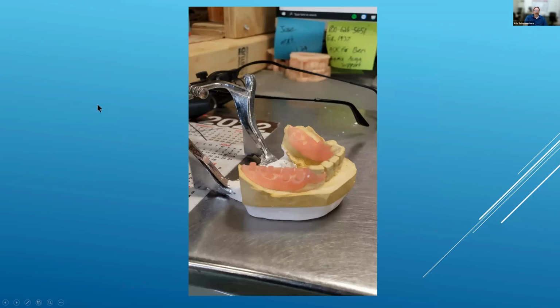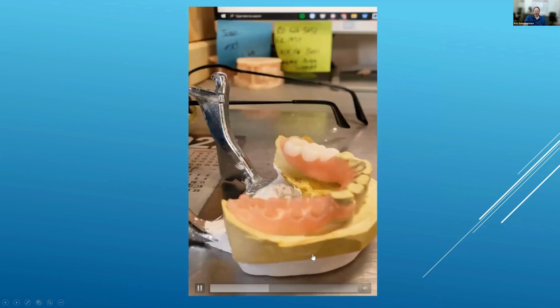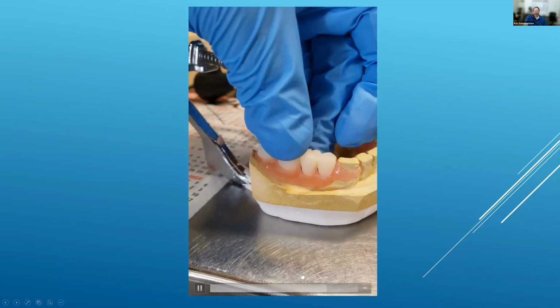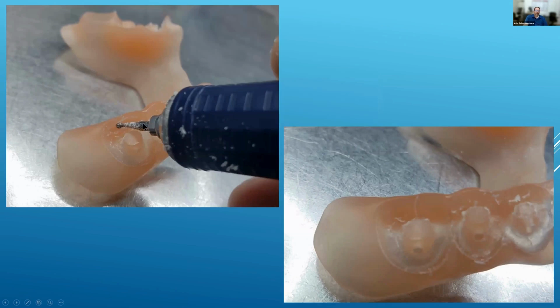So then once you mill, you can either mill or print your teeth. And these are printed teeth right out of the printer. You can still see the little bumps on the surface, and they'll just drop right down into those sockets, probably like 95, 98% of the time with no adjustment. All right. Then you're going to create a little lock on the periphery of the socket with a round burr, as well as punch some holes in those posts. Again, we're dealing with mechanical retention. We're going to have a little reaction, a little bond, but we still need to rely on mechanical.